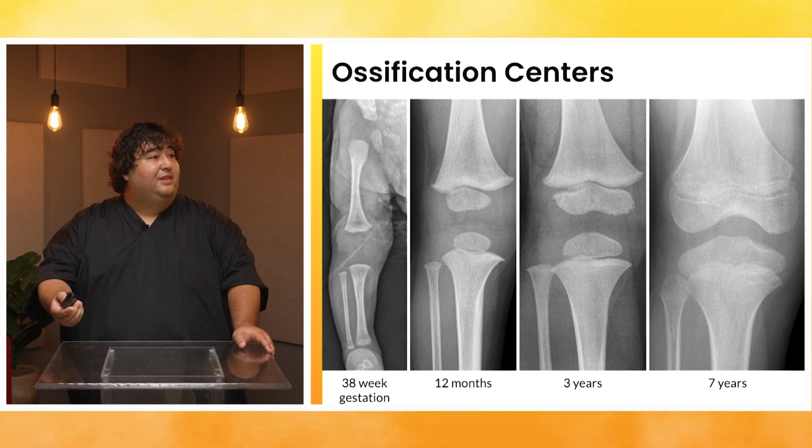And the big thing to understand here is that cartilage is not going to be radiodense, so you're not going to see it on a plain film. Right. I think the intern version of me thought that these could really slip around, but that dark space is actually solid cartilage there. It's just not dense enough to show up. Yes, exactly. And I think that's an important thing to understand.